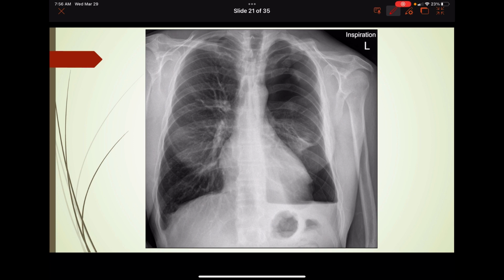It could be clavicle too, now that I'm looking at it. But he's got something going on there. And chest x-rays are notoriously bad for picking up rib fractures. But in any case, C for cardiac silhouette, heart looks fine. D for diaphragms, this diaphragm looks all right. This diaphragm here, though, you can't see. Straight line over here. Looks like he has a pleural effusion.